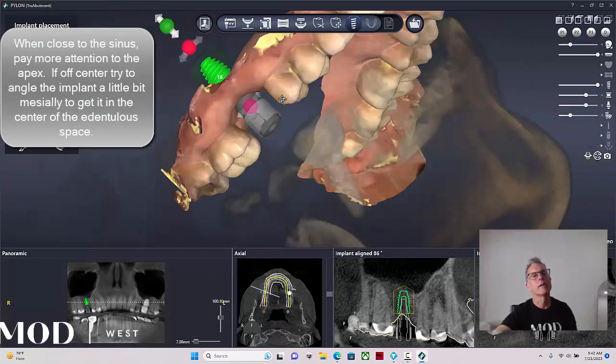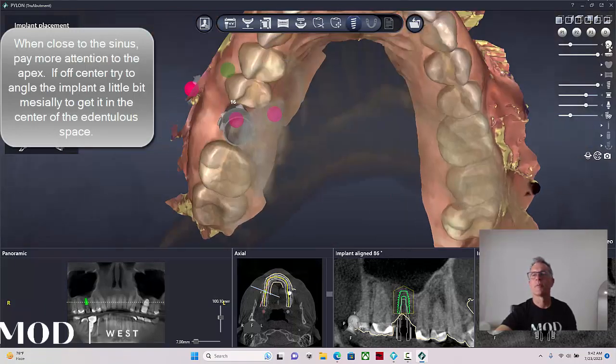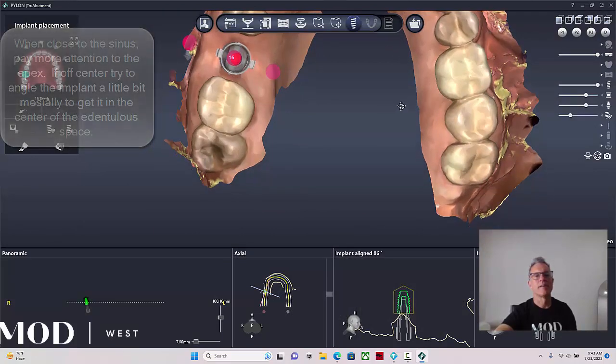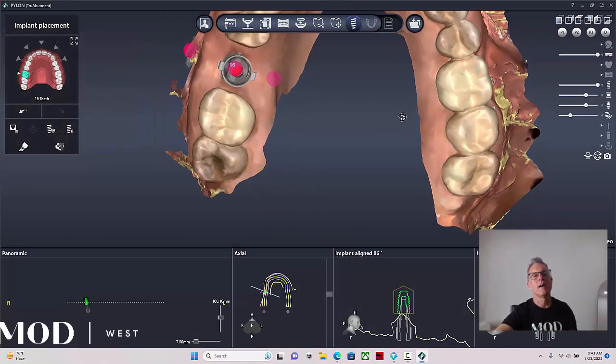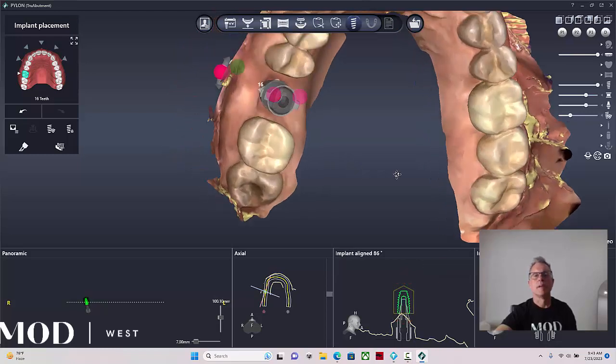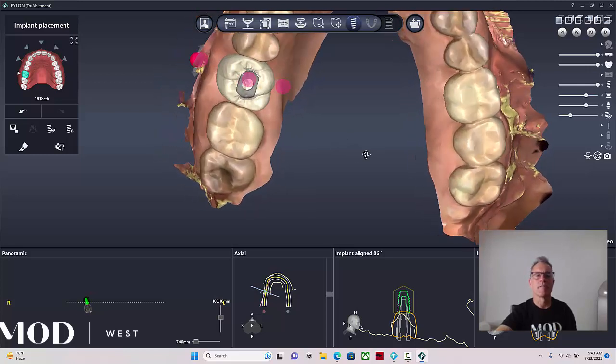And we can take a look at our model. And I apologize for my slow computer. One drawback of having this be web-based is it is dependent on your internet. Not bad. I guess if I could be really, really picky, I could scooch this over just a little bit more. A little too much. Let's go back. So now we're perfectly lined up. I'll go ahead and turn my crown back on. And yes, in fact, we're right in the center of it.